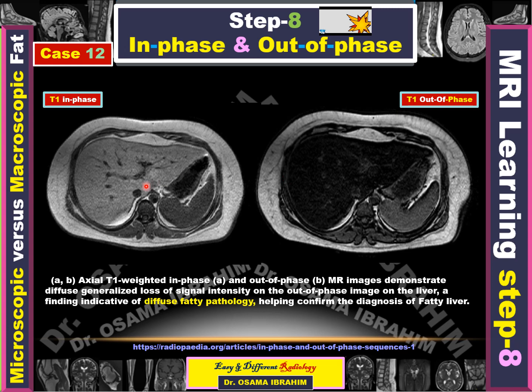So this is diagnostic for fatty liver, and this is how to differentiate fatty liver from hemochromatosis through out of phase. So this is the diagnosis of fatty liver.